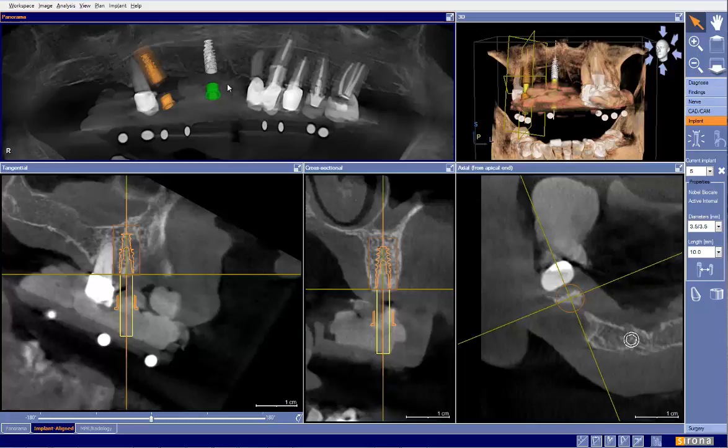As a point of note, what I have found is that CEREC registration is likely to work with all ceramic crowns, not zirconia, but all ceramic crowns, Emax, Dynamic, just traditional porcelain, Empress, etc. So there's a chance that CEREC data would be able to be integrated on 13 and 14. But that being said, there's no way to verify that integration, so they would not fabricate an OptiGuide from it.